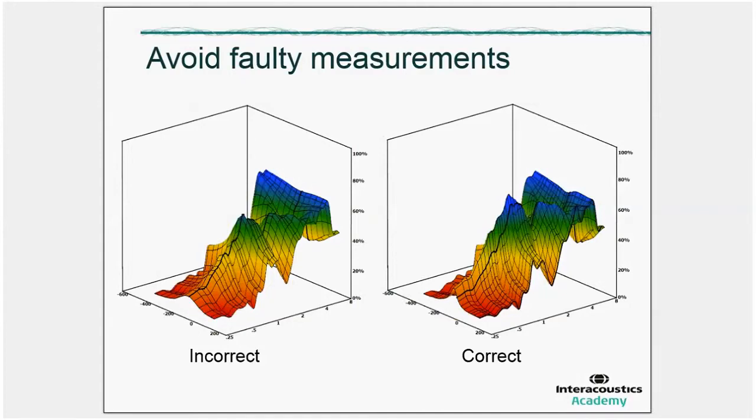The problem with the measurement on the left is that the measurement was stopped manually by pressing the stop button in the Titan suite. What happens during the measurement is that on screen you see not 100% of the data. There is so much data that during the measurement we display only 25% of it. After the measurement is done, the full data is handled and the screen is updated. If you press stop, basically all the rest of the data is ignored, and then your final result will depend on only 25% of the data, which causes it to appear as if it is smoothed very much.